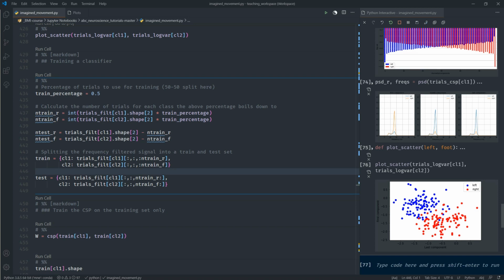Well, for model selection, we can start with a 50-50 split ratio here. So for training data we allocate 50%, and for test 50%. Of course, this is not the correct way of doing model selection.